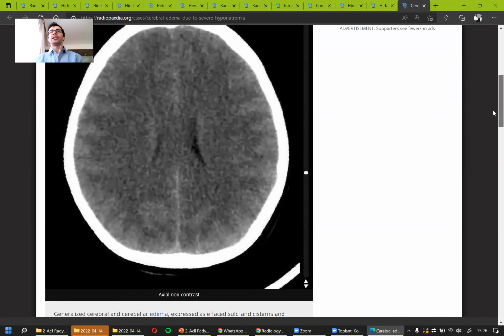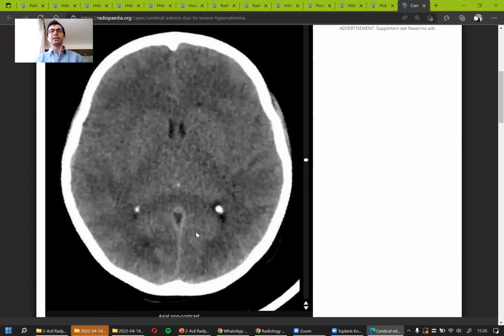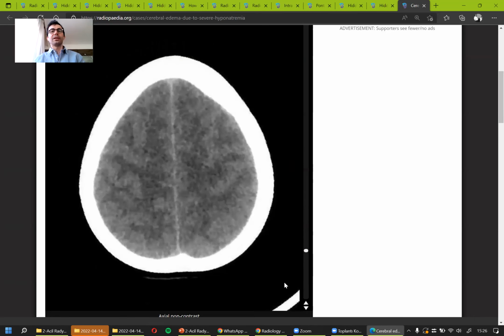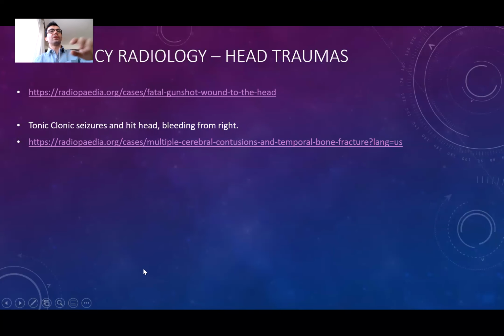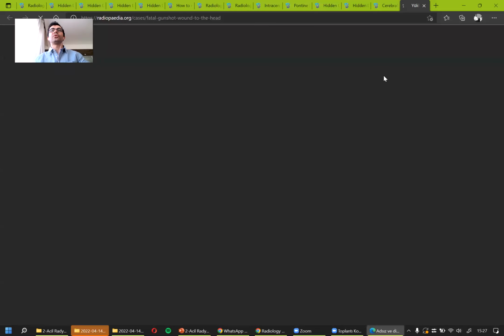So as we are going further, I recognize that you have started seeing what a normal cerebral parenchyma should look like and what it shouldn't look like, which is a good thing. All right, this was a good demonstrative case. I really like this. Let's move on to the next patient. We will do a little more.